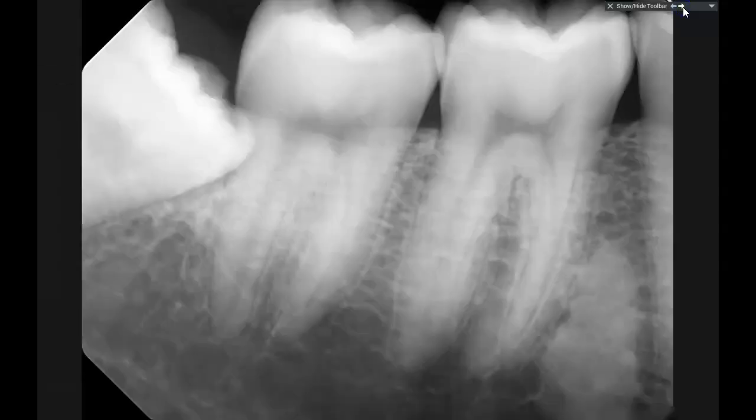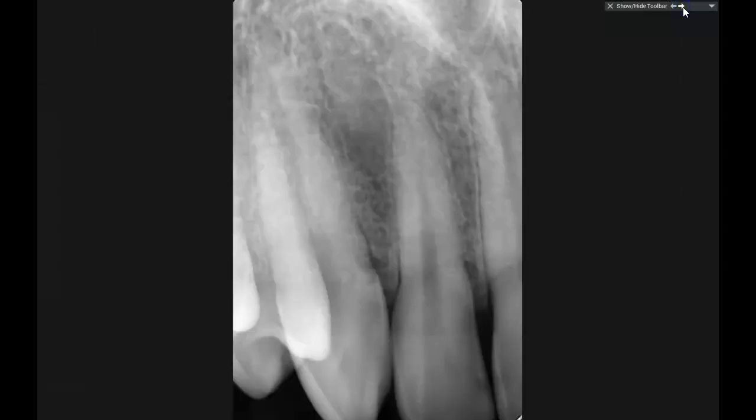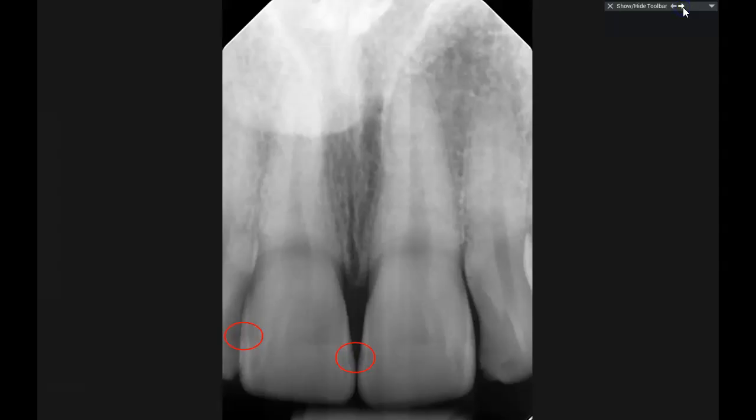So that really should be programmed so that the user can scroll through tooth numbers in order, 1 or 2 through 15 or 16, then 17 or 18 through 31 or 32, and then through the bitewings. This order is really awkward at best.